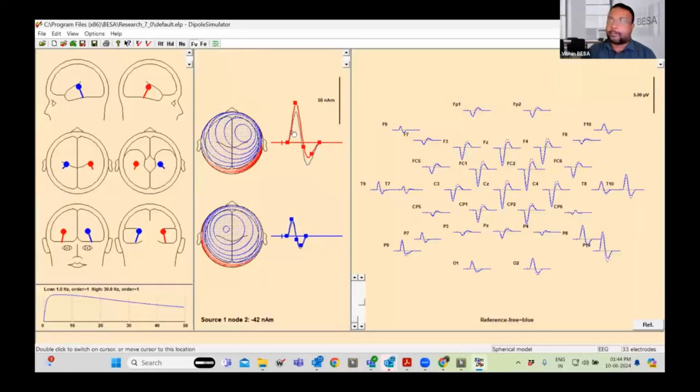Yeah. Okay, thank you. So if you see this gray, now it is not the same as the red, which means that after applying the filters, the amplitudes have slightly changed. It has come down, both this positive, the negative peak has come down. Similarly, the positive peak also has come down in this case.